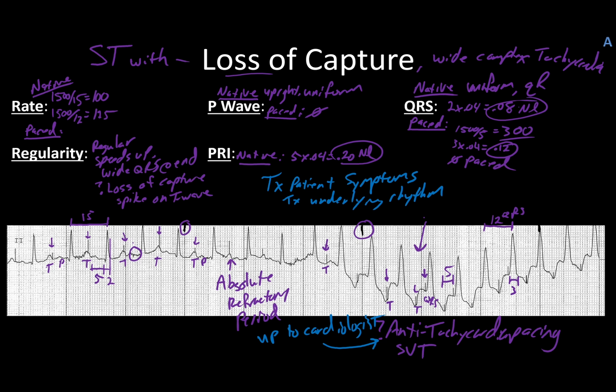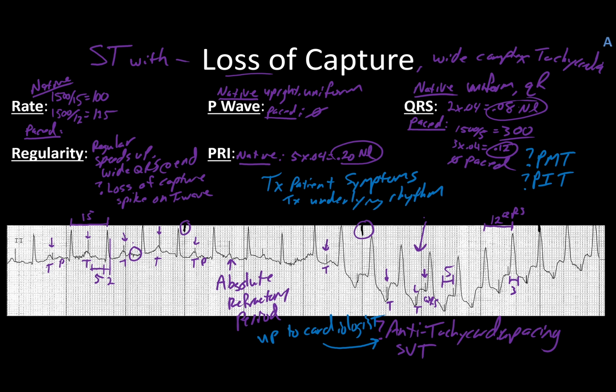And that wide complex could be SVT, it could be pacemaker mediated tachycardia, things of that nature. I'm going to throw those on here real quick, question mark. Pacemaker initiated tach. Things of those nature are what you have to consider. And that would be the final slide for that.